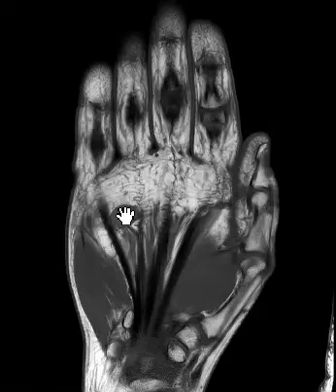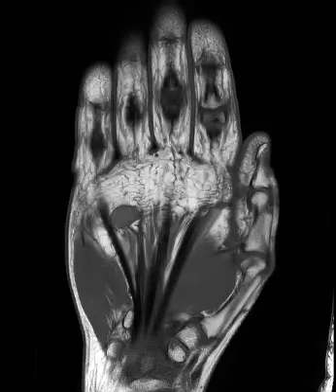Another thing that could do this is a foreign body granuloma. So that piece of hair that was there before, maybe they did not get it all out, and there may be a little residual tiny fragment in there, and they develop a granuloma surrounding that little foreign body. I don't really see a foreign body.